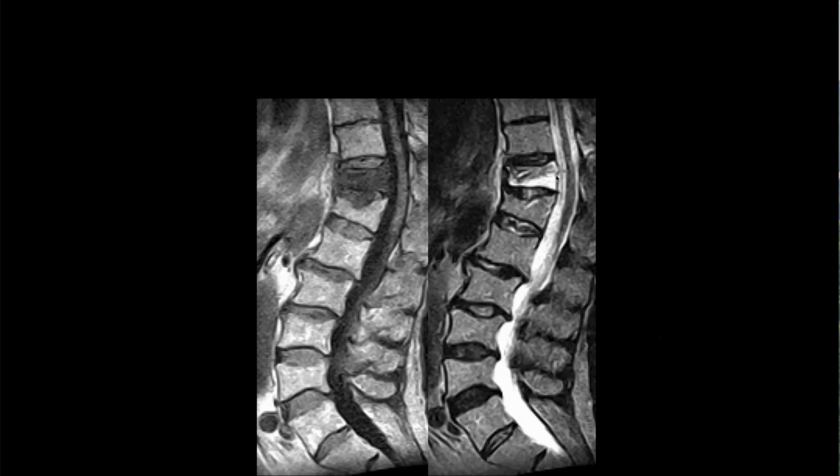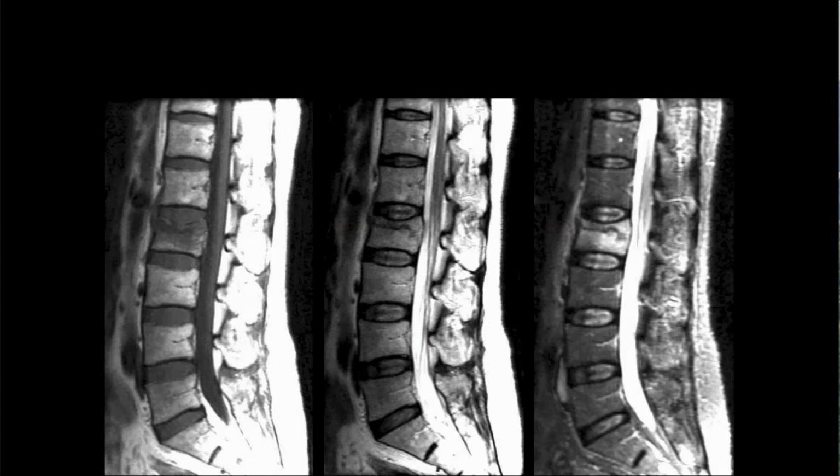Here, I would be very concerned that this is more, because I think we're actually getting compression in both the anterior and posterior cortices. So this would be kind of in between a compression fracture and a burst type fracture. And then obviously you'd have to evaluate the posterior elements, because that PLC complex is very important for prognosis. So I guess we call these compression fractures. Okay. Elior.